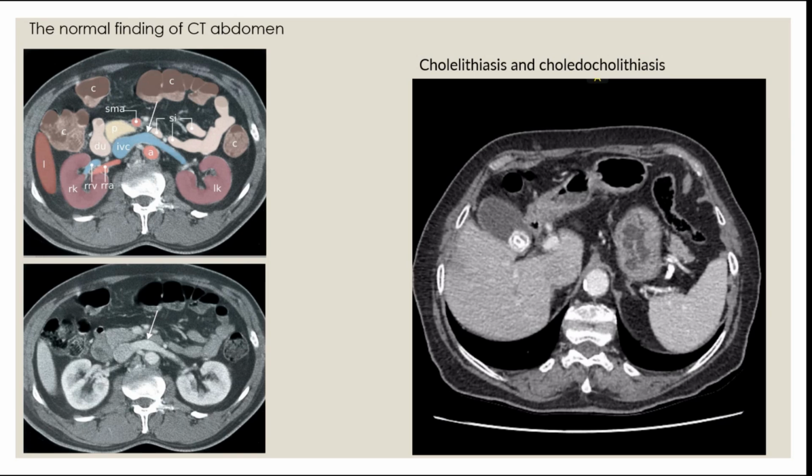I'm sorry, we can continue. For the, we can see the colon. We can see, yeah, the duodenum. This is like a beige color.